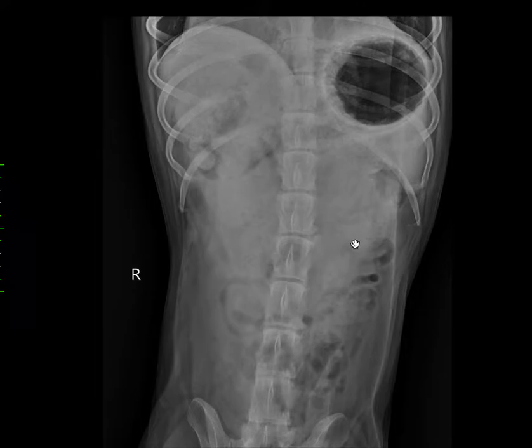When the colon is empty, this process is harder. The colon often in dogs goes across the cranial abdomen like the position of the transverse colon, like you see here. Now, in the right cranial abdomen, I'm going to take a little bit of a leap of faith. I can see that the colon is going in this direction with a fecal ball here and a little bit of gas distension. So I'm therefore comfortable to interpret some of this mixed opacity that I see here instead of being an issue or a lesion, some of this is probably just due to superimposition of the colon.